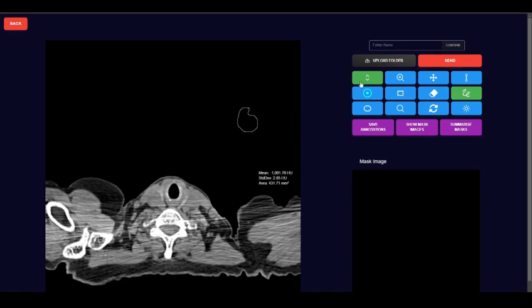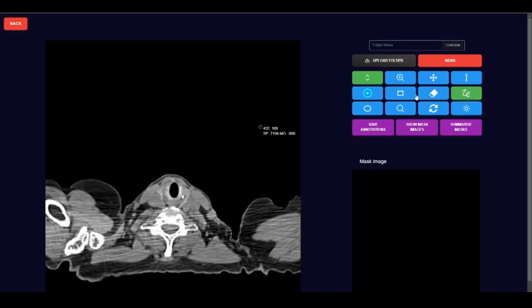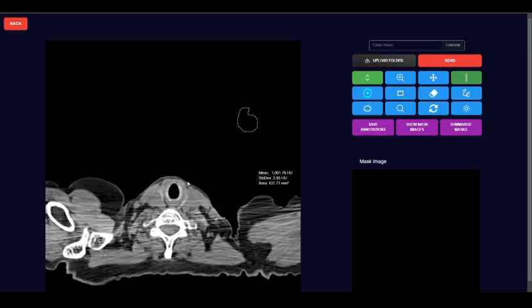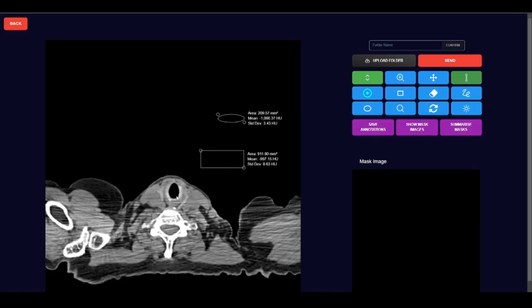So yeah, I've already briefed you through this, and as you can see, there are four ways to make annotations. One is a probe, which is basically a point, and the next one is an ellipse, a rectangle, and finally the freehand drawing. There are other tools that look like annotations but are not exactly annotations. Like over here, there's a line tool, which basically lets you find the distance between 2 points. Like over here, the distance is 13.47 millimeters.